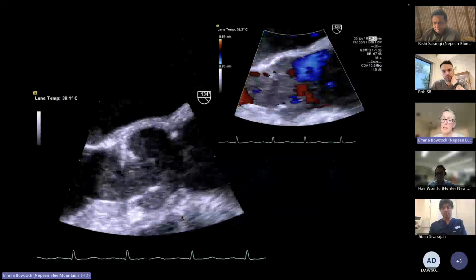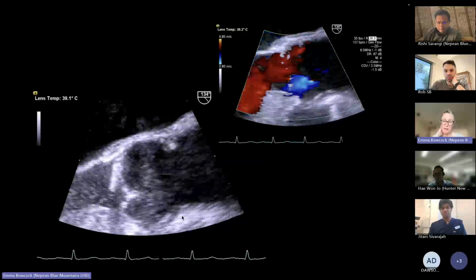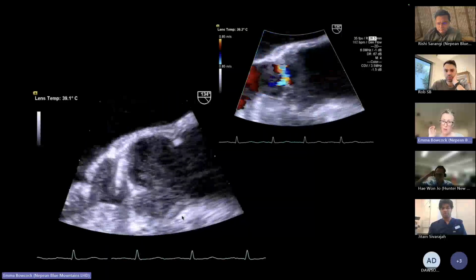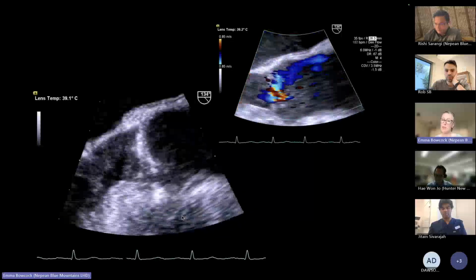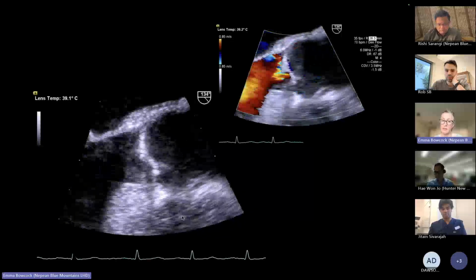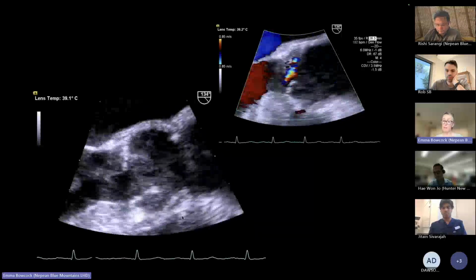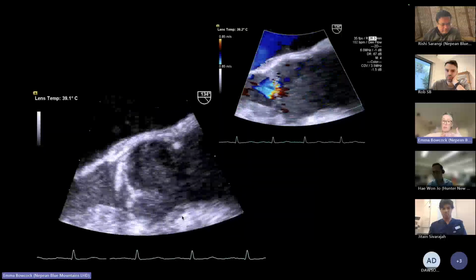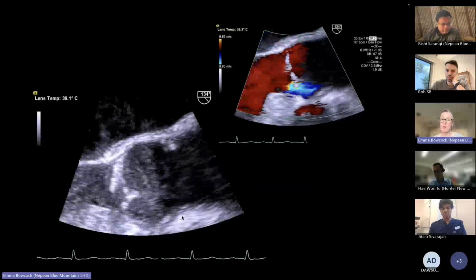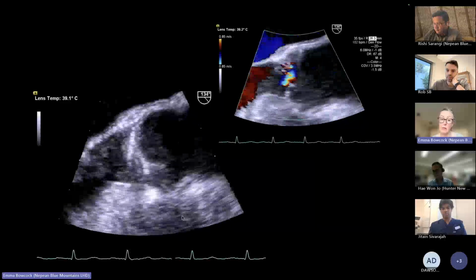And there are different mechanisms for aortic regurgitation in dissection. I think we've been over this in the aortic regurgitation talk. You can either get some of the dissection flap hanging down into your LVOT, leading to a coaptation defect. You can get tethering because of aortic root dilatation, so you get a coaptation defect with tenting of the leaflets, or you can flail your cusp as well, so you can get a flail cusp into the root.